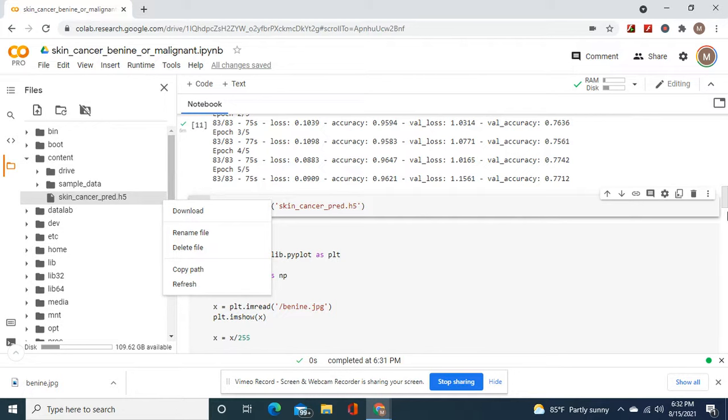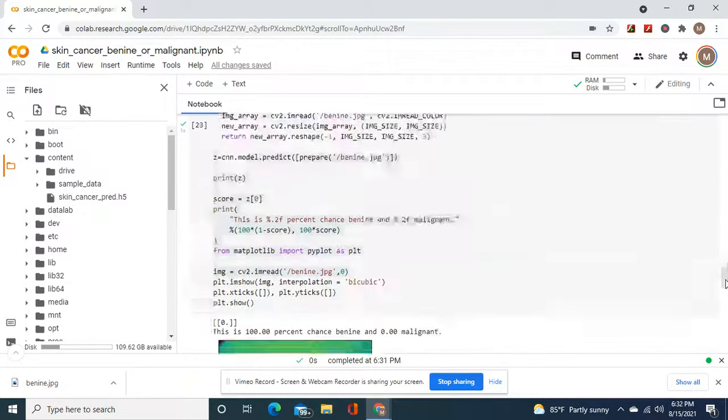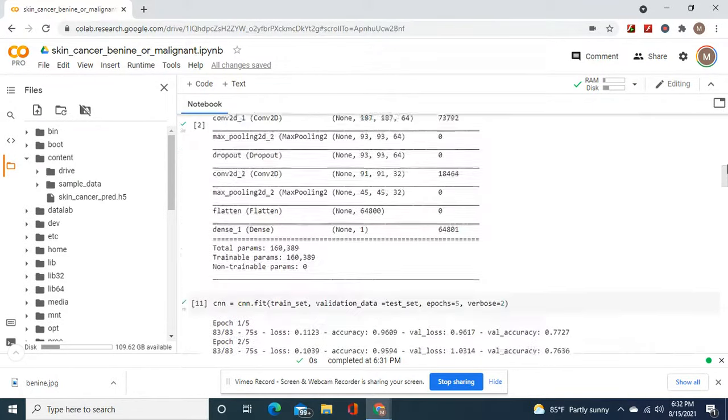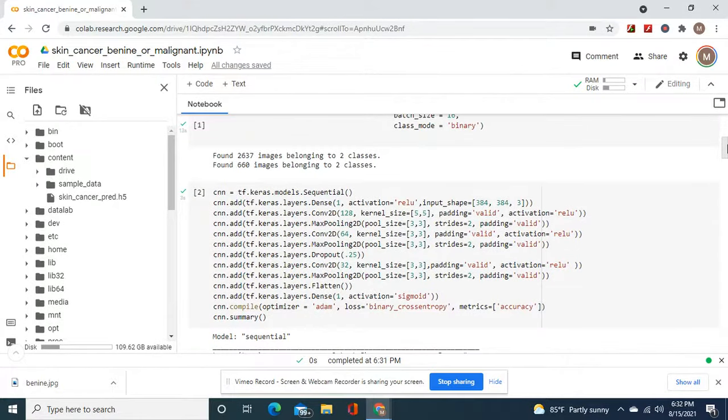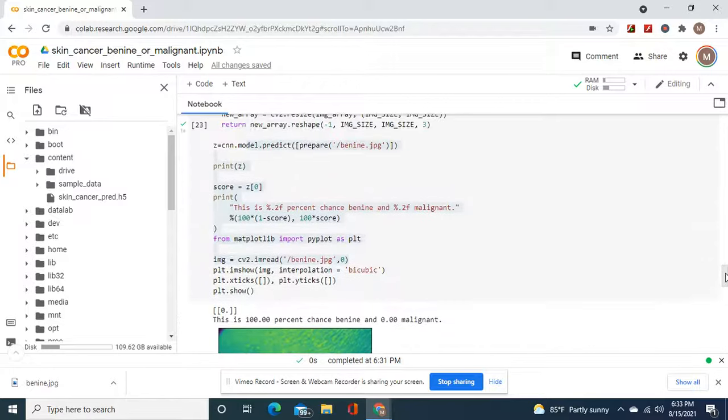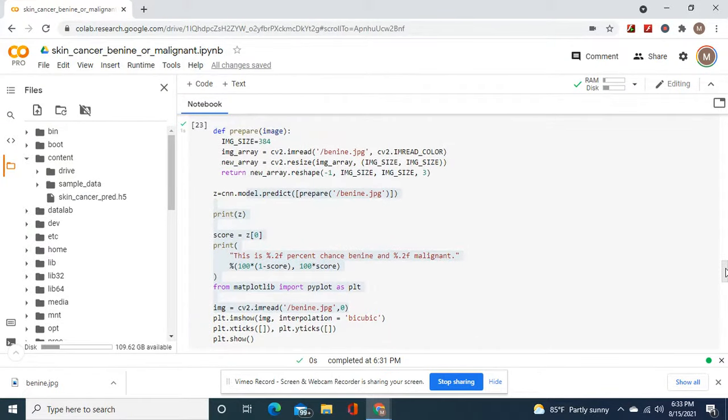Because remember I showed you guys? Image size 384, which is the same as your target shape and your input shape. Because it's on the same axis. Now, you might have to switch this to 1 depending on your axis, but most of the time, no.